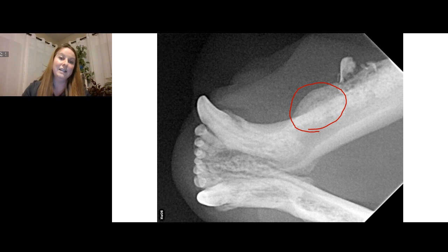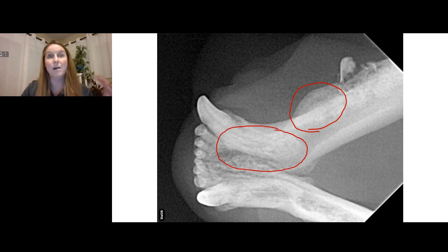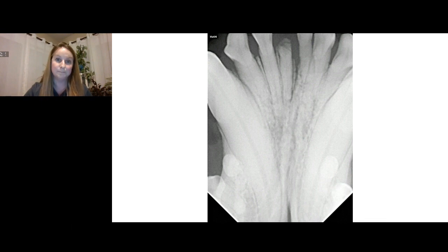So then this here, what do we need to do? Well, if that is at the level of the gum line or higher, we definitely need to treat that tooth. This guy over here, yeah, absolutely. We need to make sure we're treating things that are causing pain in our patients. If it is completely in that apical region, or even within the 1/2 of that root section, we can monitor some of those, and some of them might progress really rapidly, and some of them might be able to hang in for a little while.